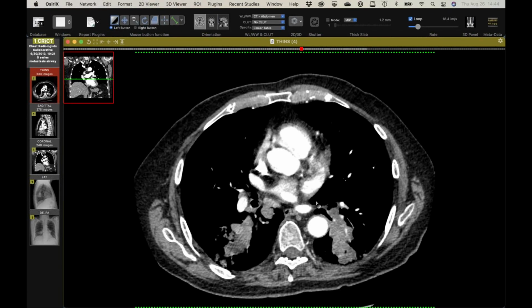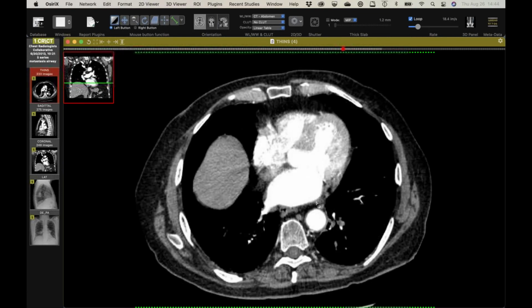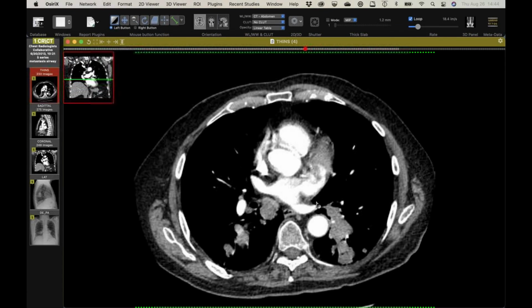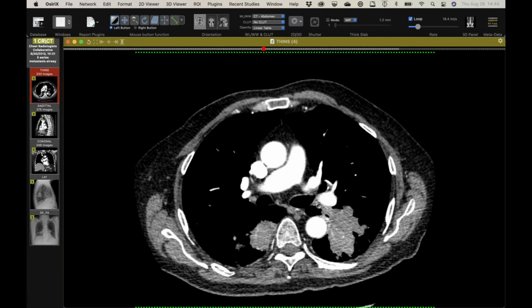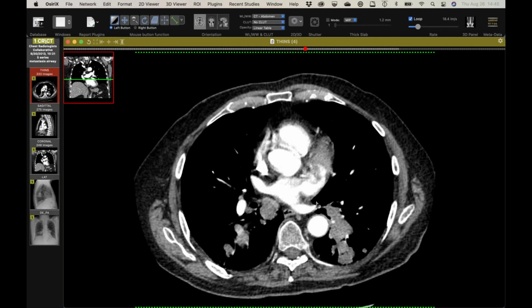Renal cell probably is one of the more common, but these aren't particularly hypervascular. And this ended up being, they biopsied these. He had findings in his abdomen that suggested a GI malignancy. And this is all colon adenocarcinoma. And these are probably some of the most exuberant endobronchial metastases I've ever seen, and ones that had a nice radiograph to go with it. So I was just waiting on path confirmation from this case, but yeah.